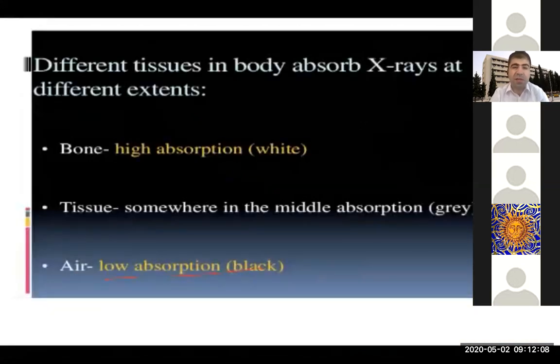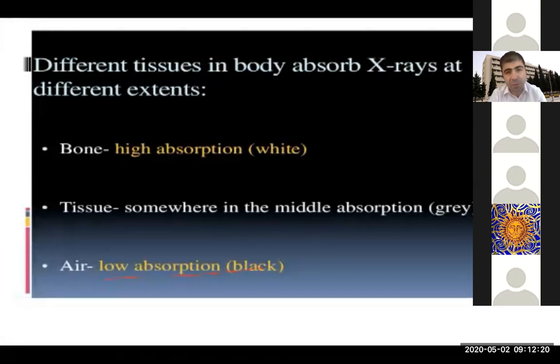In any chest X-ray, we have about three densities according to the absorption of the X-ray. If there is too much absorption of the X-ray, for example bone and metallic shadows, they will be whitish in color. With a dense tissue or foreign body, there will be no X-ray beam hitting the cassette, so it will be whitish.